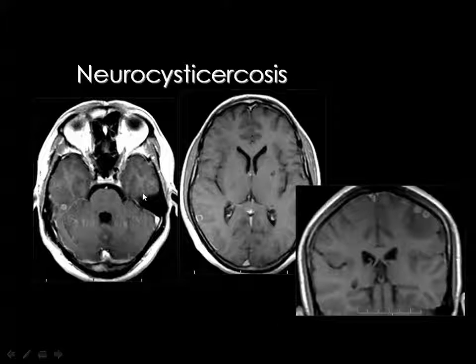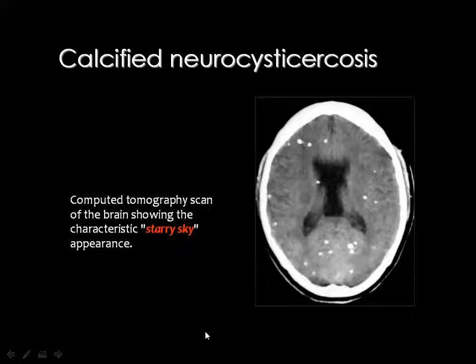And this is a patient with lesions where you may be able to see the cyst and dot sign somewhere, like this one. Then you get to the diagnosis of cysticercosis. If you cannot appreciate this, you will diagnose this as tuberculomas, and you will not be so far from the right diagnosis.